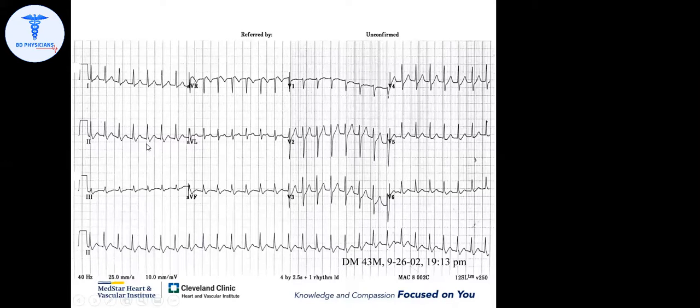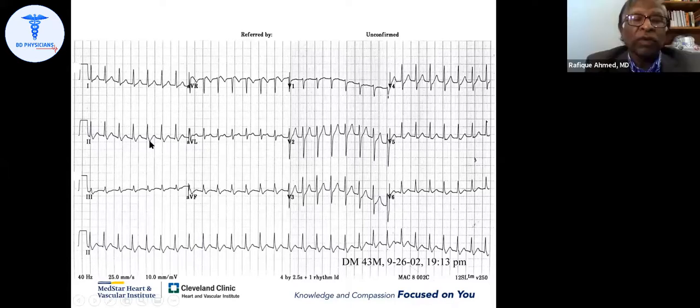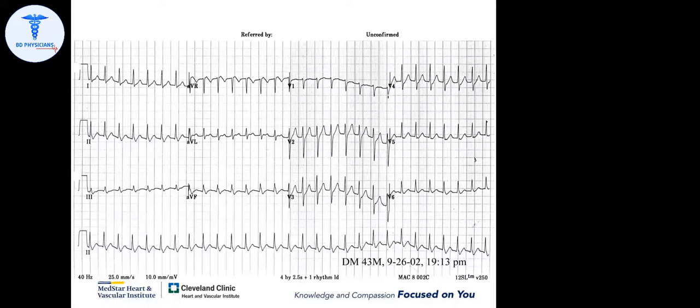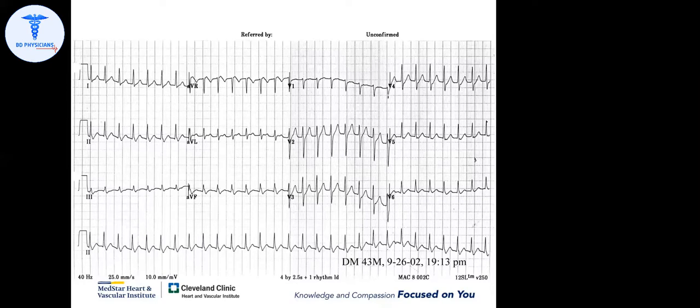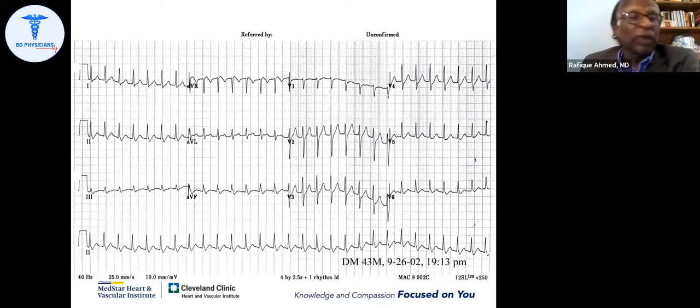Yes, sir. So what do you think? It is very close to the QRS complex. Yes, sir, this is short RP. So here you will not use that term. When you see it that close, you don't use that term. It is almost over the QRS. So what is the diagnosis? It's a junctional tachycardia. A little bit better one.